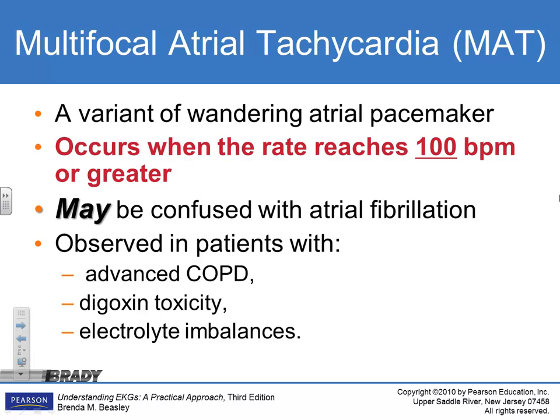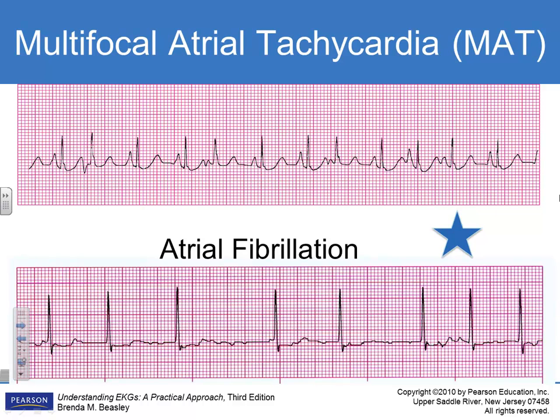We see this in patients very ill with COPD. If they have some type of toxicity from digitalis, we see a lot. Of course, they don't use digitalis quite as much as they used to. Electrolyte imbalances can lead to this. I put both of these up so you can see the differences.